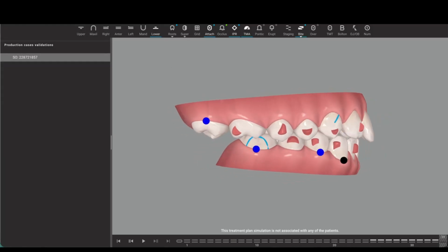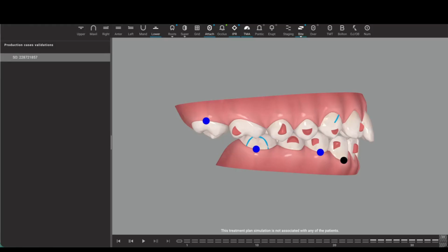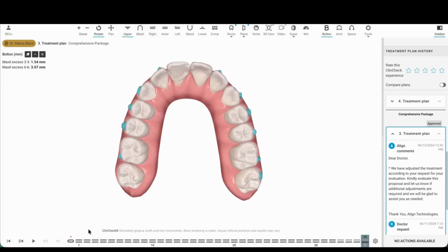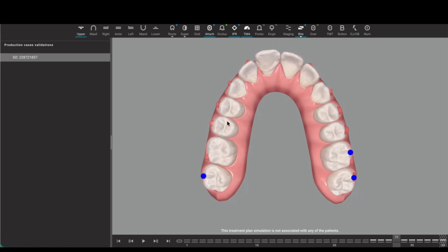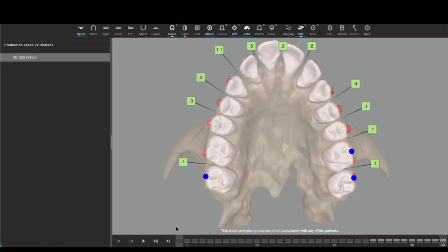And then let's take a look at the other side. This is final tooth position of the approved ClinCheck, and this is final tooth position in the first ClinCheck that came back. So a couple things you'll see, I must have decided that I didn't want to rotate this premolar as much as the software was putting in. So let's take a look at that real quick. If I were working on this case, would I take away some of that rotation and replace this one with a retention attachment? Maybe. That would be a question of finishing, and I would just have to make that call based on CBCT integration and other factors. Did I feel like that rotation was appropriate, or was it overdone and I'd want to actually remove it? Those are the things that we take care of in that last 20%.